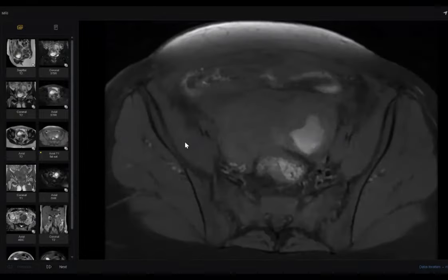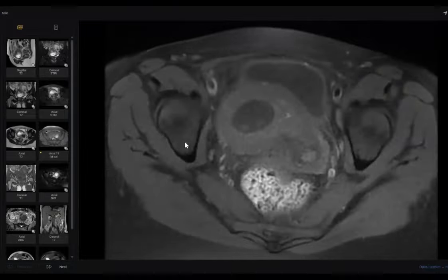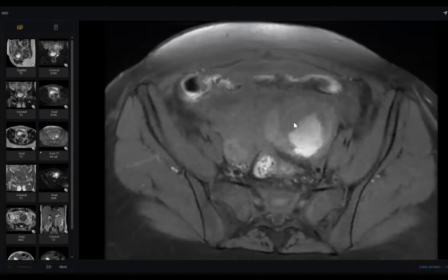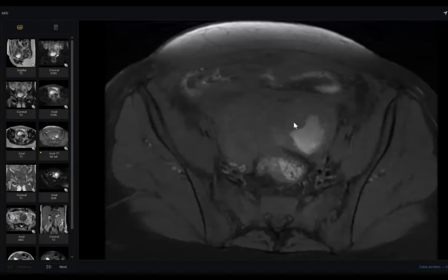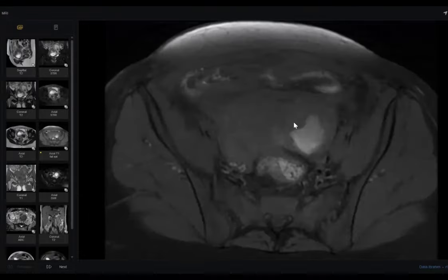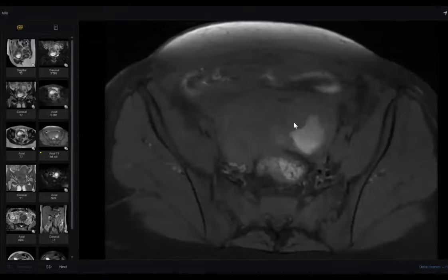Okay. Give me some differential diagnosis. What is the possibility of a pregnant woman with an adnexal lesion like this? So it could be a hemorrhagic cyst, could be corpus luteum of pregnancy, but the ovary won't be that enlarged. What else?